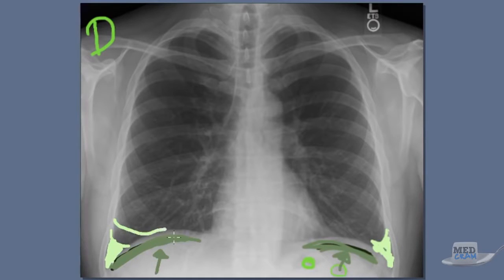Maybe this would be a lot of a pleural effusion. And this would be bilateral pleural effusions that you might see. Meniscus sign means it's tracking up the side, like that. Okay, so that would be a sign of a pleural effusion.